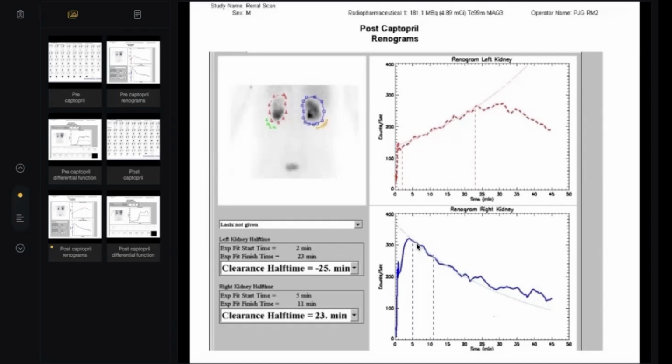Then after declining from the beginning of the decline, this is the excretion. Do you think there is excretion till here or no? No, till here it is uptake. Yes. Excellent, excellent. Doctor, has this case been proved to be renal artery stenosis or not, in your opinion? Yes. Why? Because there is a positive difference, a decline of the function of the left kidney post-captopril.